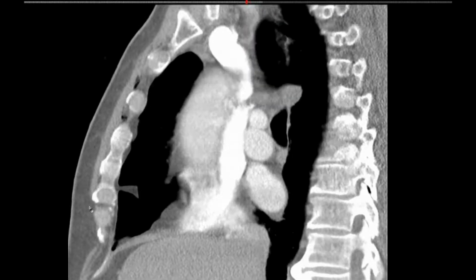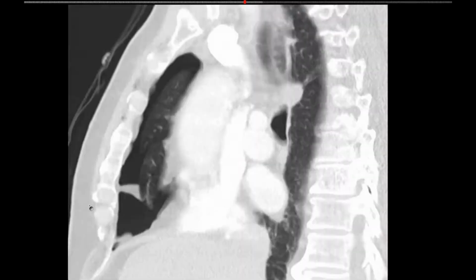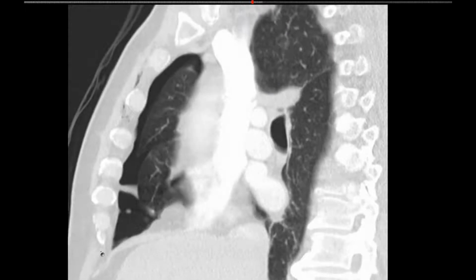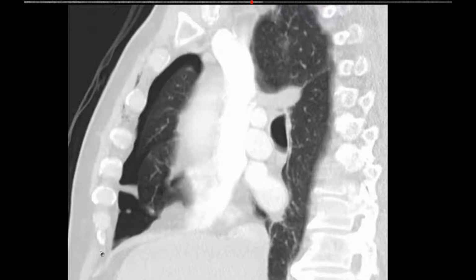Very nice example. So this is an example of how plastic the fat is. The fat just fills all the spaces that are allowed in the chest. It's very pliable, it's very plastic, it gets molded into things. And the pleura sucks. So the fissures suck, and they suck parietal pleura into them, and the fat is just part of that loose connective tissue. It's very stretchy and it just moves along with it.